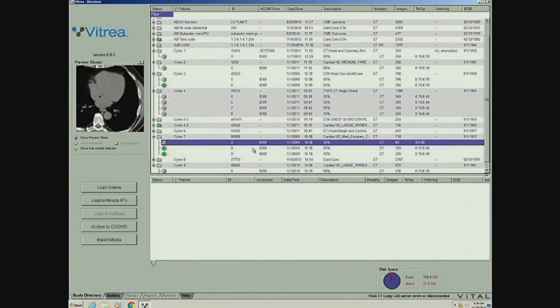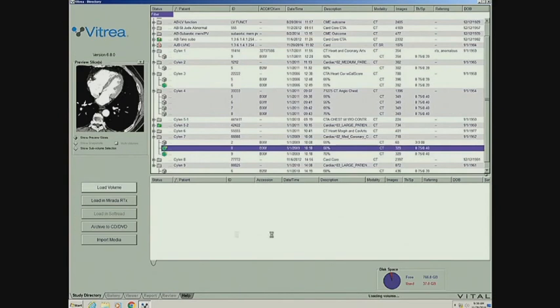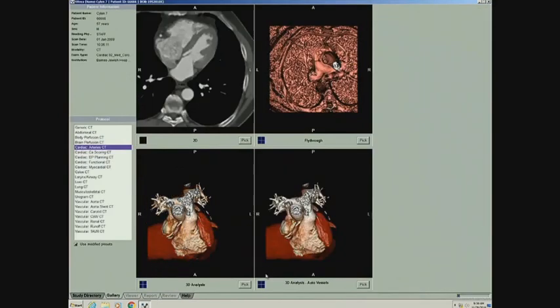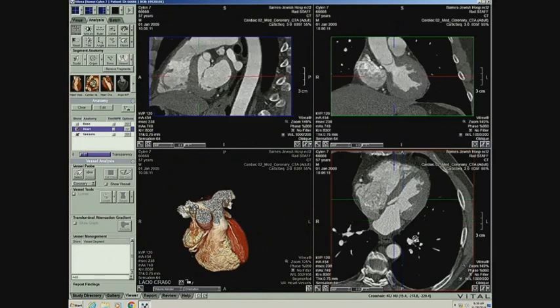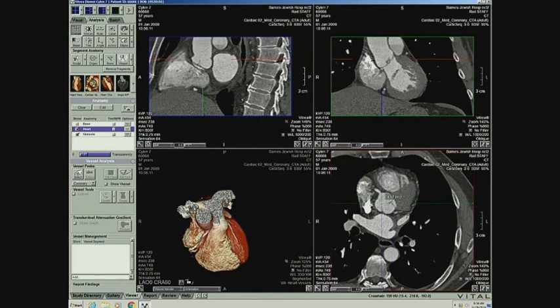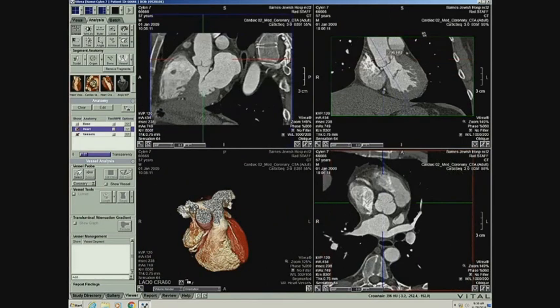Sorry about that, it gave me the wrong series. Do the same thing we did before again. Go to the root, double oblique it.